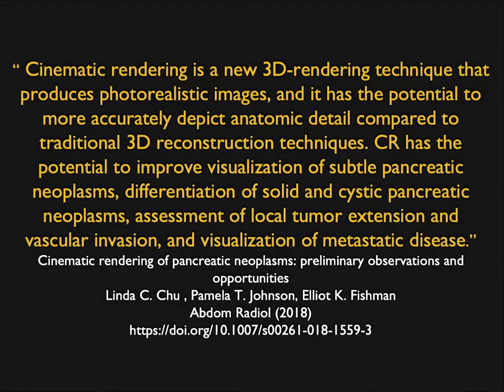I mentioned last time, or the last thing I mentioned was about cinematic rendering. Now, in part 1 of this talk, I showed you a lot of images, how we're looking at the texture mapping from cinematic rendering to help us detect tumors, to help us classify tumors, and then creating the vascular map to help us stage tumors. So there are many things you can do. There's a good article by Linda Chu on this, or at least some of our initial work.